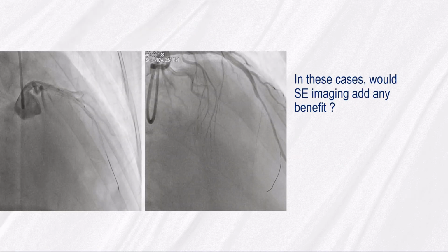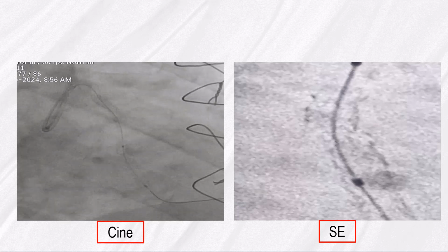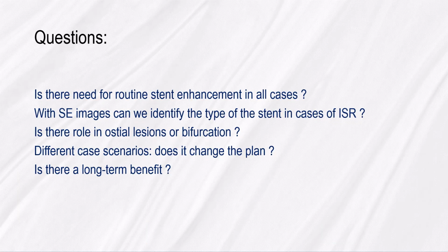In these cases, would stent enhancement imaging add any benefits? And in this case, is there a difference between the cine image and the stent enhancement image? In this video, we will answer the following questions.